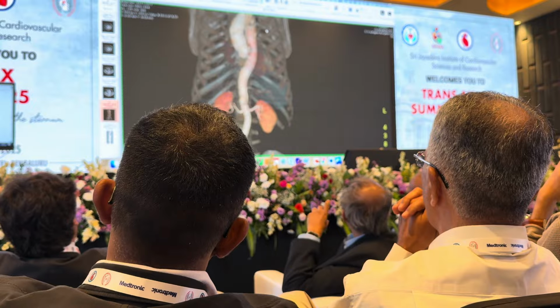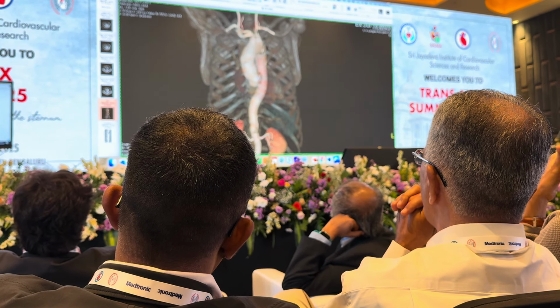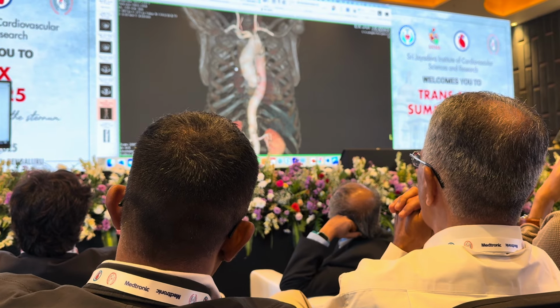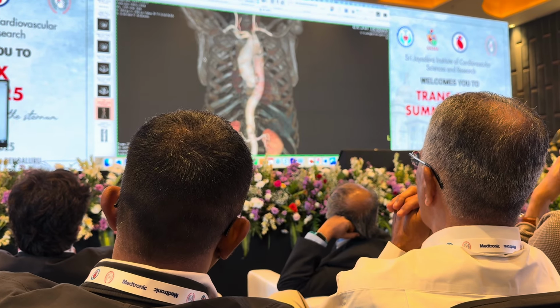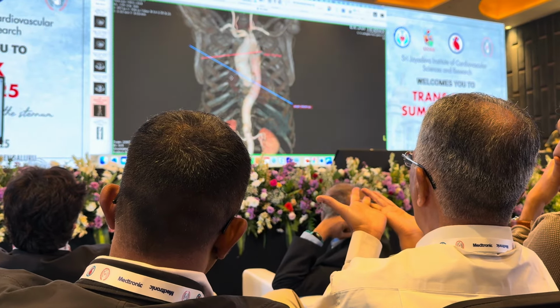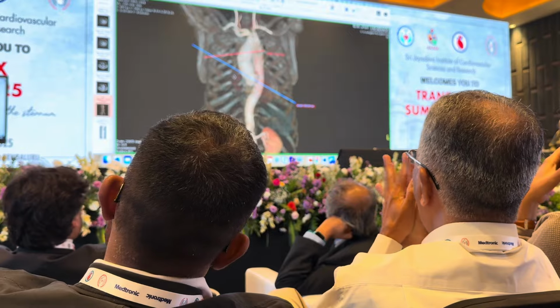I can do better. With this kind of reconstruction that we had from the radiology department of the Bangalore Hospital here, it's even more, it's beautiful. First, second, third intercostal space. You see the pulmonary vein in front of you. You see the right atrium. You can understand, same consideration. You can have the clamp here. This will be your view. The pulmonary vein will be right in front of you, as the right atrium. So again, very easy, very nice to plan your operation on the CT scan. I think that was all. Thank you.